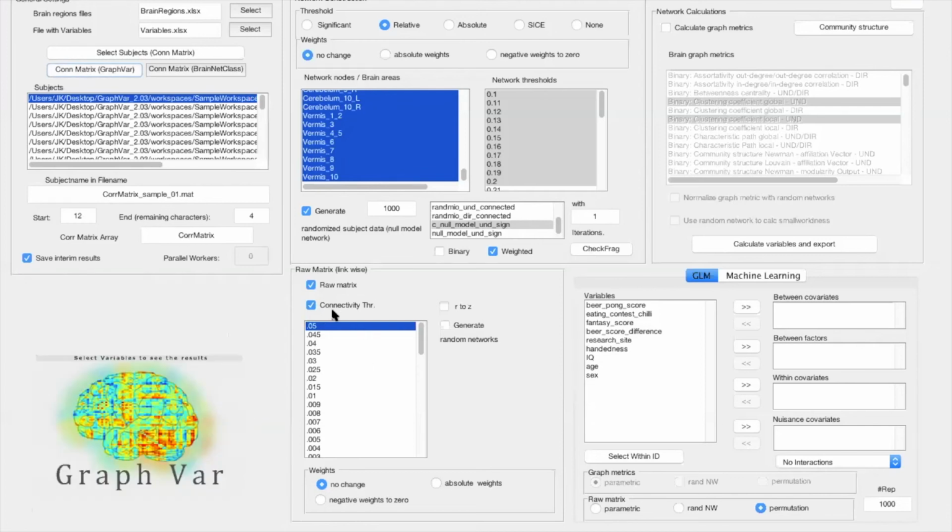This could be a little bit more valid in its assumptions, because you do not know if your data essentially, as I just said, underlie this Gaussian distribution. Maybe it's a different one, so it makes sense to actually derive the non-parametric p-values by those bootstrapping approaches. Okay, and those are the significance values again, similar as in the significance-based thresholding here at the top. Then we give you the possibility also to modify the weights. This is again similar as at the top here, where you can modify the weights.